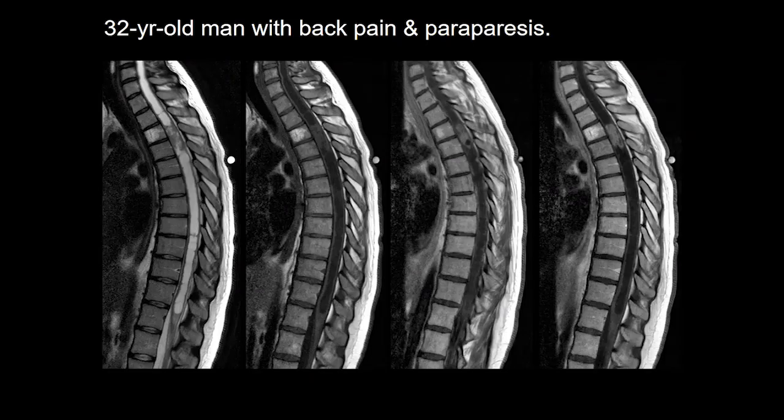What about this particular case? This is a 32-year-old man with back pain and paraparesis. Again, an expansile heterogeneous lesion is seen which demonstrates enhancement following contrast administration. Some intratumoral and polar cysts are seen. Notice that there is no hemosiderin cap. Well, no hemosiderin cap means that I would favor the diagnosis of an astrocytoma.